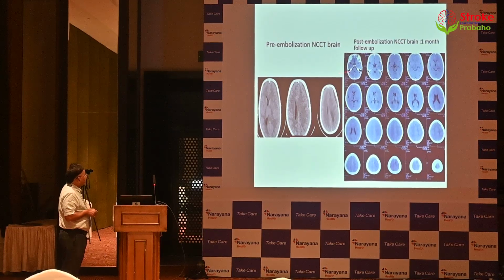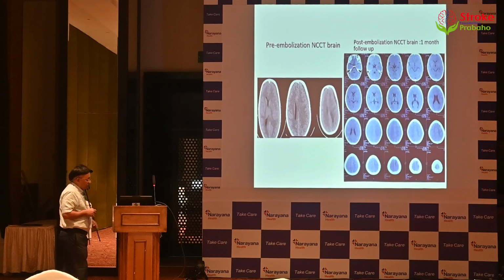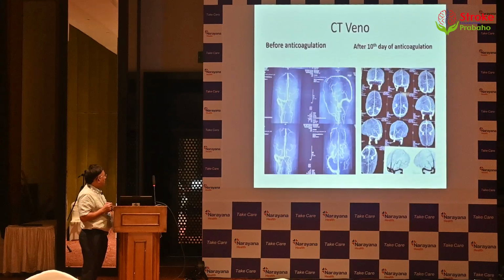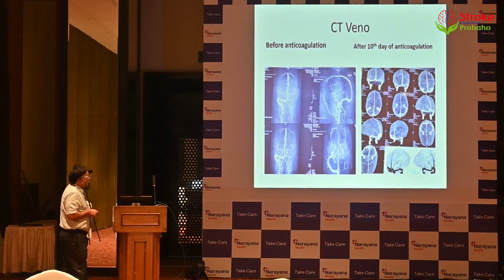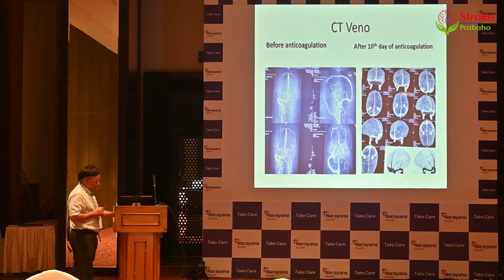Pre-embolization CT, and this is post-embolization CT after 1 month. There is no hematoma or no SDH in this case. And now the patient is at follow-up after 7-8 months. She is walking now. And with anticoagulant, this is before anticoagulation, and this is after 10 days of anticoagulation. There is very good recanalization of the venous system.